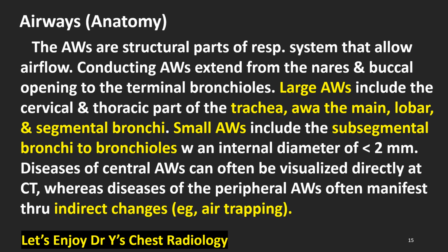Diseases of central airways can often be visualized directly at CT, whereas diseases of the peripheral airways often manifest through indirect changes, for example, air trapping.